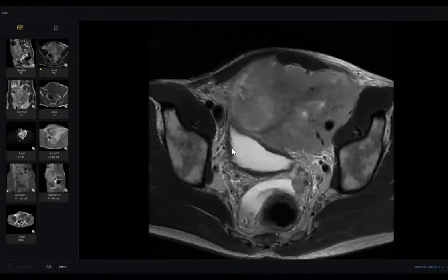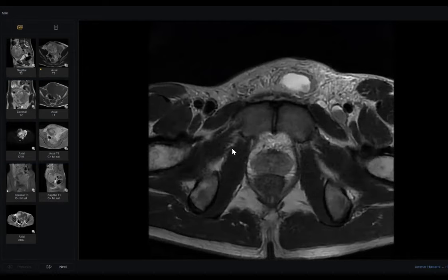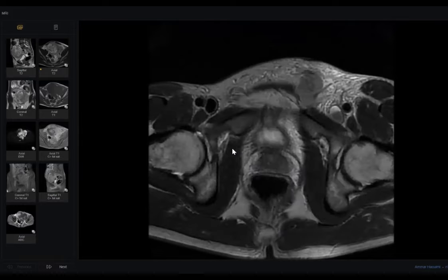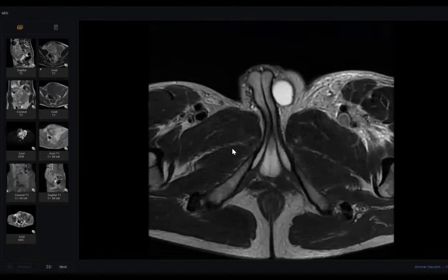Thank you, doctor, so much. This is a male patient, and some examiners would not tell you, but look here, external genitalia, he is male. You did very well when you described and followed the mass. It goes through the left inguinal region, and this is fluid. Look here.